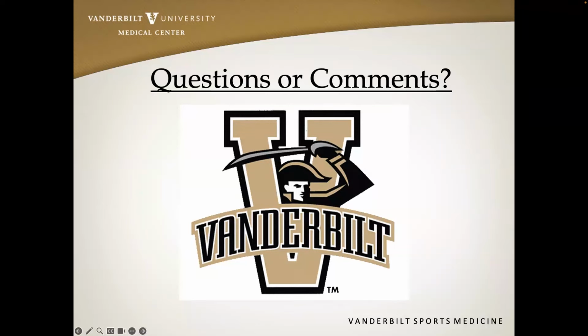Now there's a superficial infrapatellar bursa, and that is always pathologic if you see fluid in there. And usually the superficial infrapatellar bursopathies are associated with some type of abnormalities of the distal enthesis of the patellar tendon. I've rarely ever seen this in isolation, maybe just once or twice from direct trauma, but it's usually associated with, again, a distal pathology of the enthesis. So again, great start and really good case presentation.